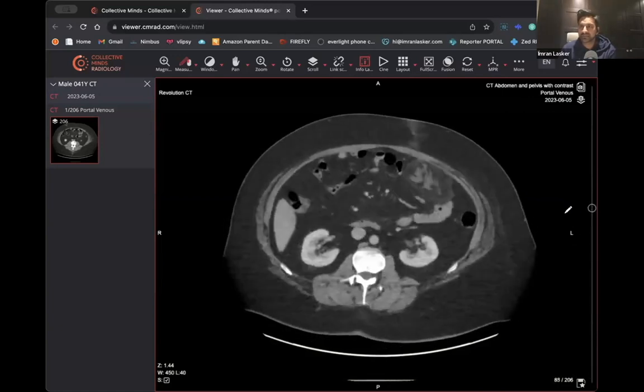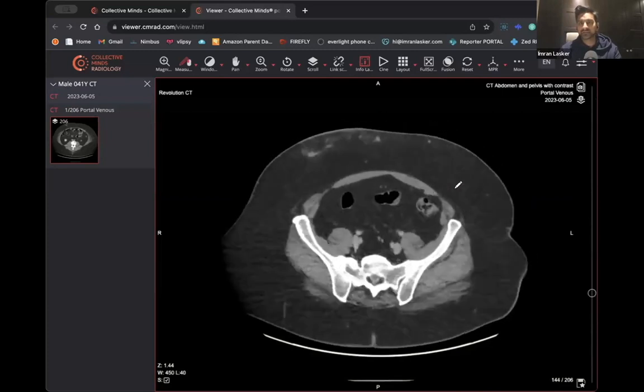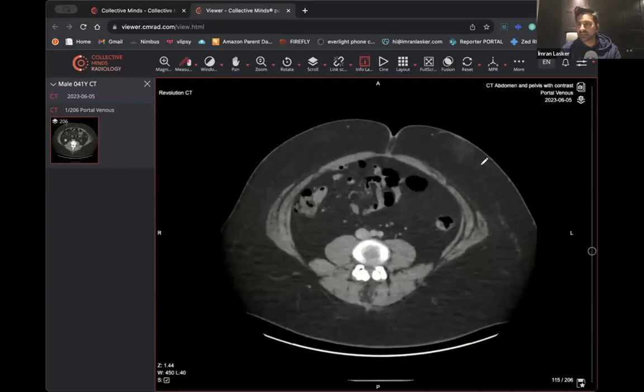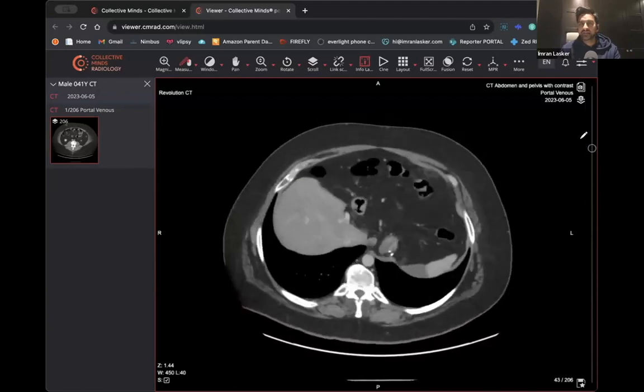I suspect the person that has messaged here is talking about this region over here, and you'd be completely right. There is something not quite right about the area. We've got to try and figure out what is going on, what's actually happening with this patient. You may have noticed they've got a whole load of subcutaneous fat stranding there, and that's most likely, yeah, exactly, well done, because they're diabetic and they've had insulin injections and that kind of thing.